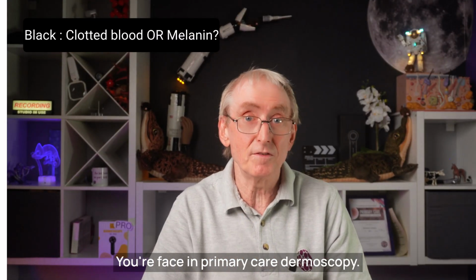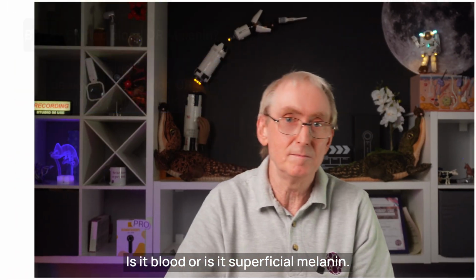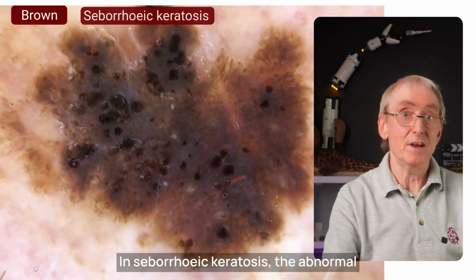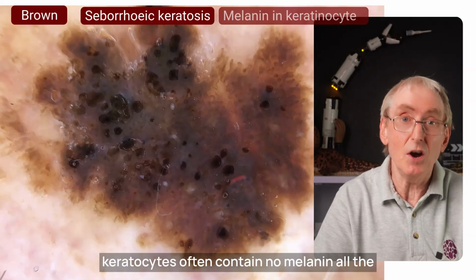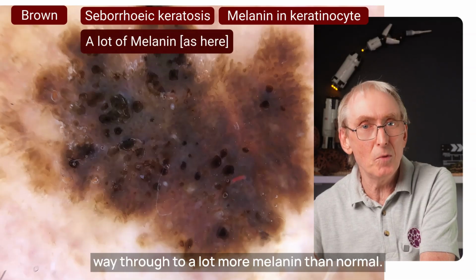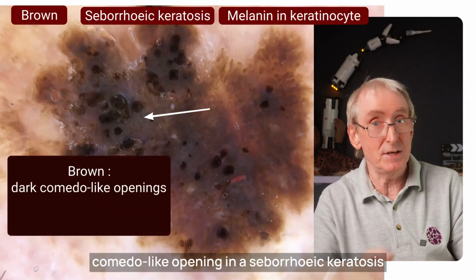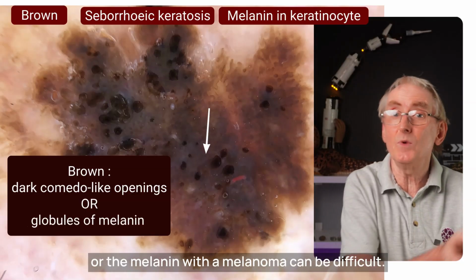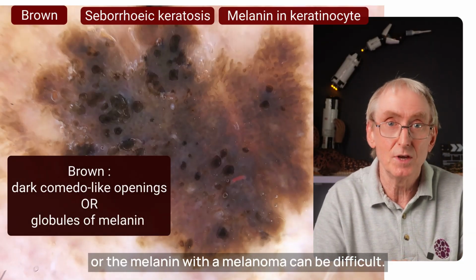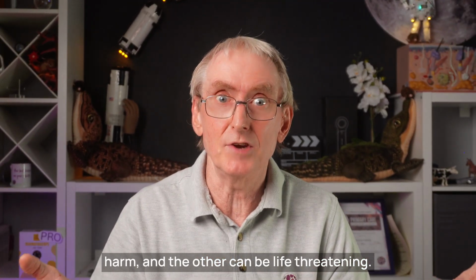This is a common question you'll face in primary care dermoscopy. Is it blood or is it superficial melanin? Brown can be tricky too. In seborrheic keratoses, the abnormal keratinocytes can contain no melanin, all the way through to a lot more melanin than normal. And deciding whether a brown globule is a dark comedo-like opening in a seborrheic keratosis or the melanin within a melanoma can be difficult. This matters because one is benign and no harm, and the other can be life-threatening.